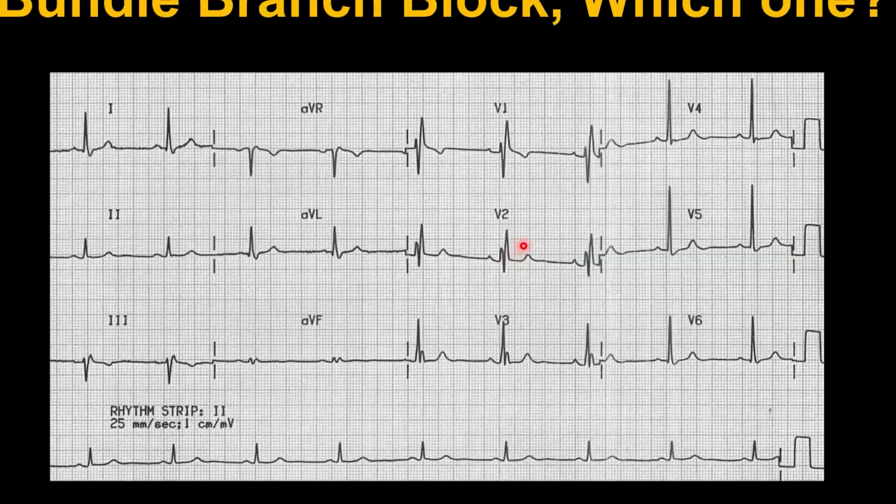All right. So here we have a normal sinus rhythm with bundle branch block. Which one is this? Right or left? Okay. Want to put it in the chat? Anna says right, and she is correct. Right, this is right bundle branch block. Typical right bundle branch block.